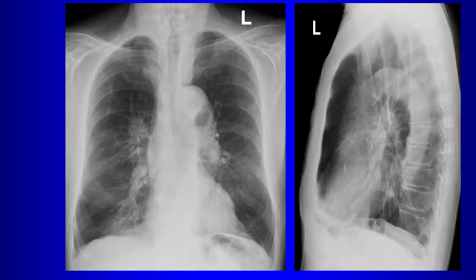Left hilar opacity causing pulling on the radiographs toward it. The left hilar opacity? Thought so, because I think you're saying the right side is pushing on the other side. I'm not going to say. The patient's going to tell you. Do you guys see it or not? Right hilar opacity. Look at this over here. See that? Big round thing over the pulmonary artery on the right side.